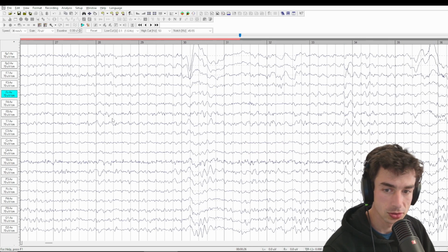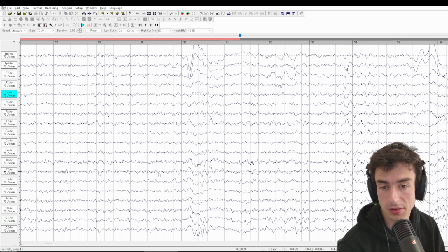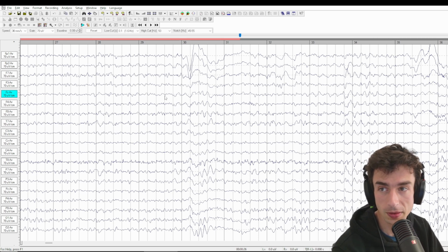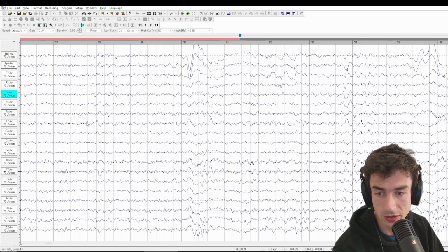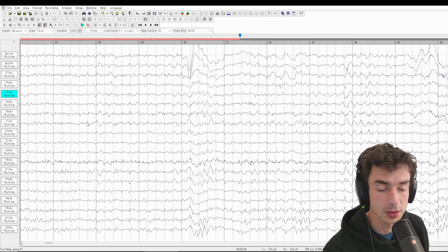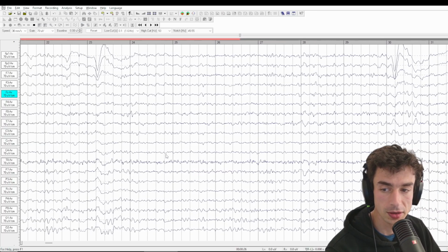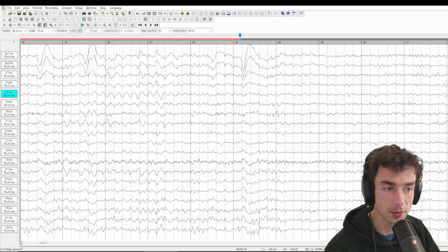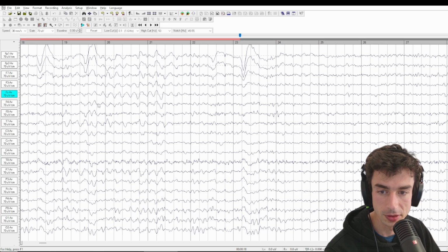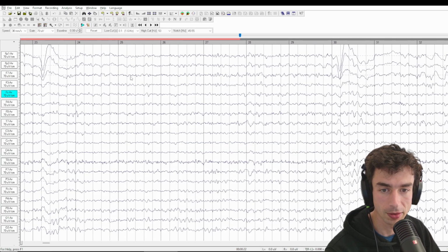So it's starting to look like we're going through different states or different phases of vigilance, right? In the European model, they only look at vigilance in the eyes closed. But when someone is sleep deprived enough, we can see changes in vigilance even in the eyes open. And we have some evidence that that is happening here because of the prevalence of this theta, followed by a pretty significant reduction in the background power here, only 25 seconds in.